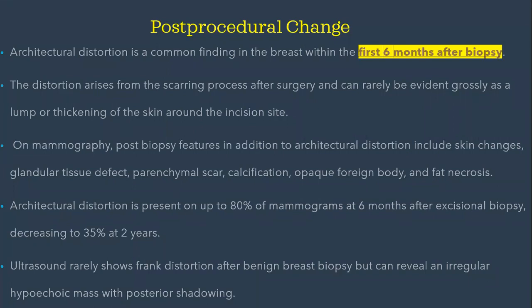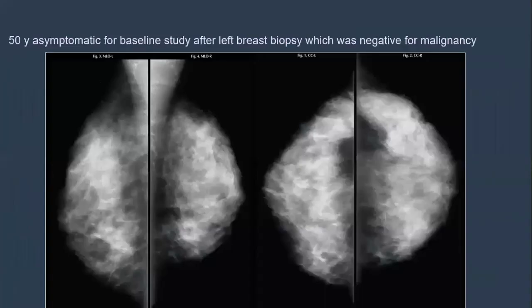Architectural distortion is present in up to 80% of mammograms at 6 months post-excisional biopsy, decreasing to 35% at 2 years and so forth. Okay.